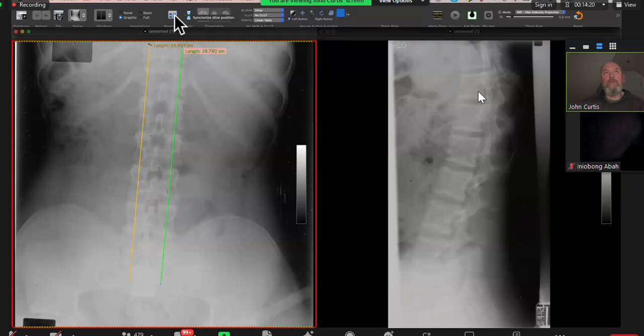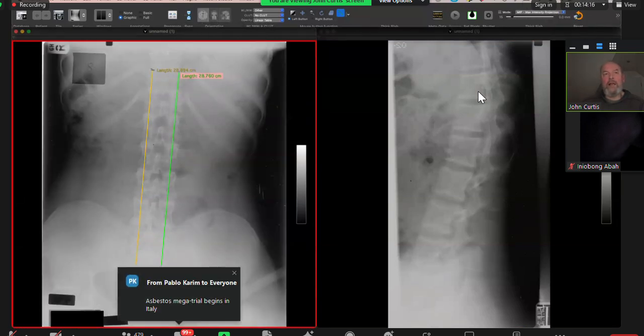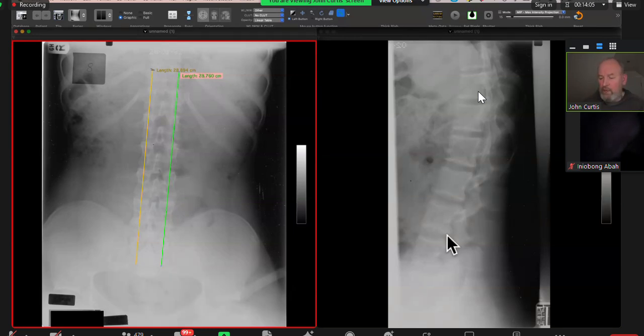Just there. So the champagne glass pelvic inlet and the squaring of the iliac blades. And this is achondroplasia, posterior scalloping. Yeah, very well done. I thought you did really well.